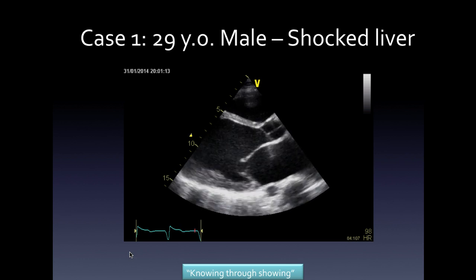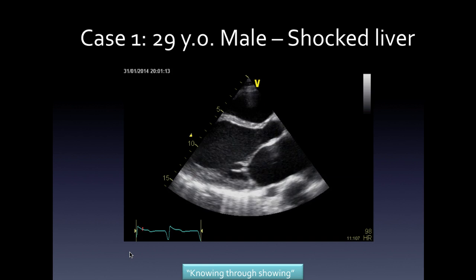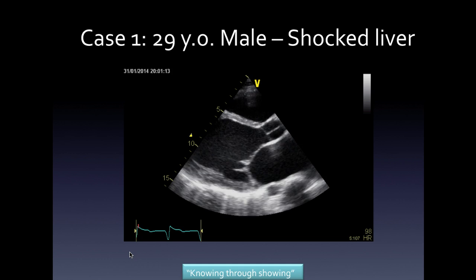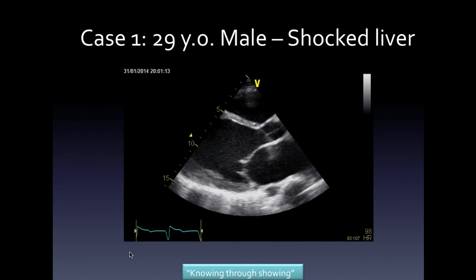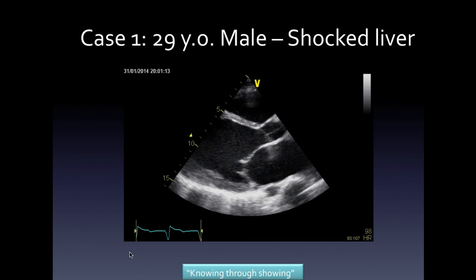But he presented with acute vomiting and nausea, very unwell, pale as a sheet, and a highly functioning individual, and just fell off. Came into a hospital, was treated with fluids, didn't have a particularly low blood pressure, lowish blood pressure, not truly shocked. And they did liver function tests, and he had transaminitis in the 2000s. So he had a shocked liver. And this is his echo.